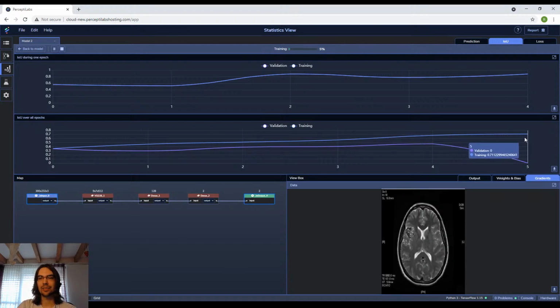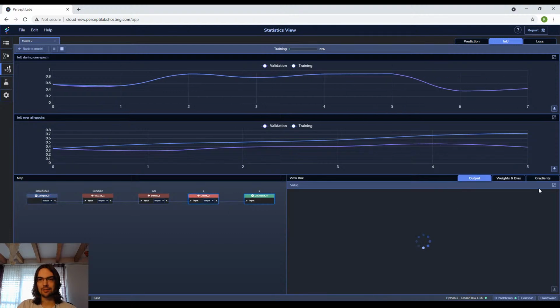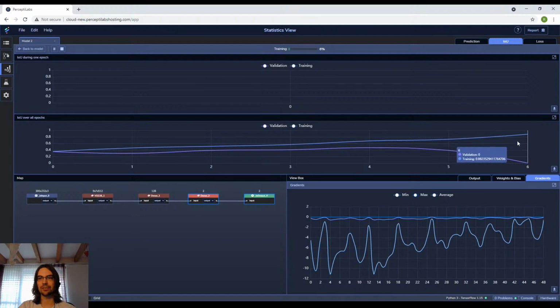Okay, well, it's getting better and better. I figure we maybe let it go to 80% or so, see that it can get at least decent accuracy before we stop and maybe try a stacked CNN.